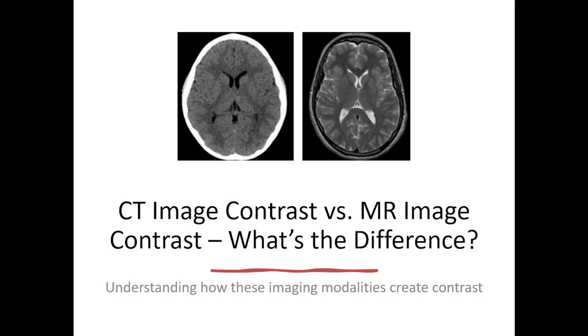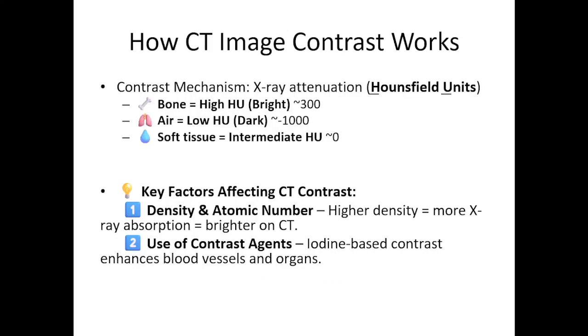Hey everyone, have you ever looked at a CT scan and an MRI scan and wondered why they look so different? Today we are breaking down the key differences between CT and MRI image contrast so you'll never be confused again. By the end of this video, you'll understand how CT and MRI create contrast, when to use one over the other, and real clinical examples of contrast differences. Let's dive in.